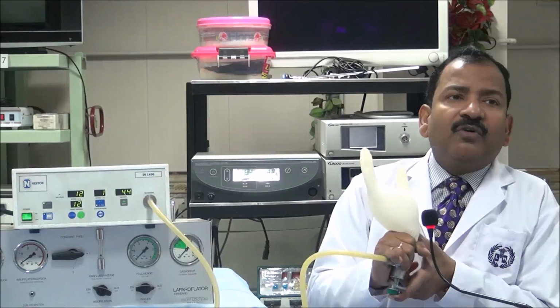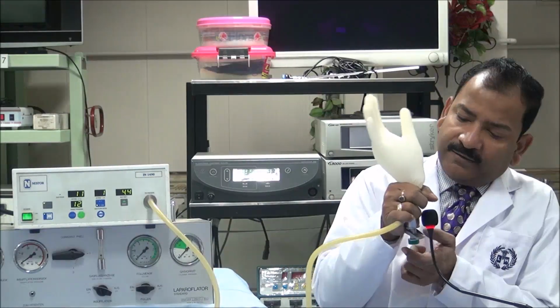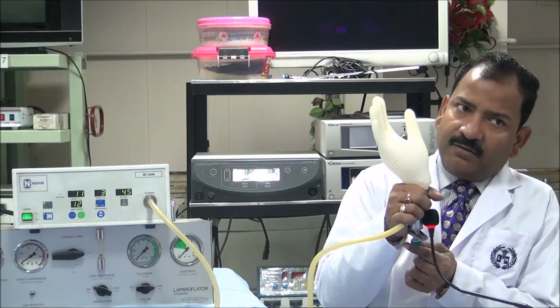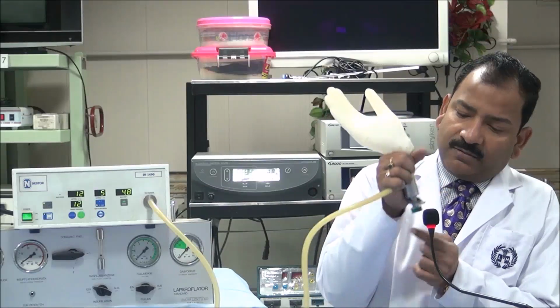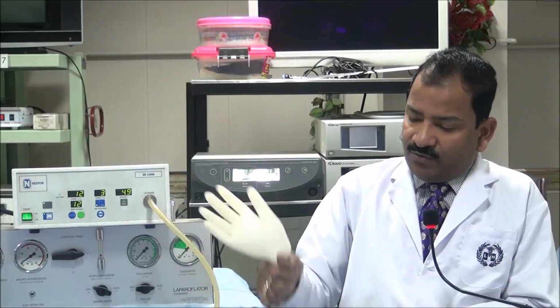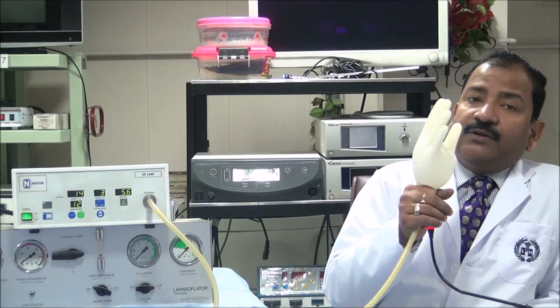So right now flow is 0. Can you see that? But now I am leaking. Now flow is 5. Let me put directly, then you can appreciate the sound better. So right now it is 0.